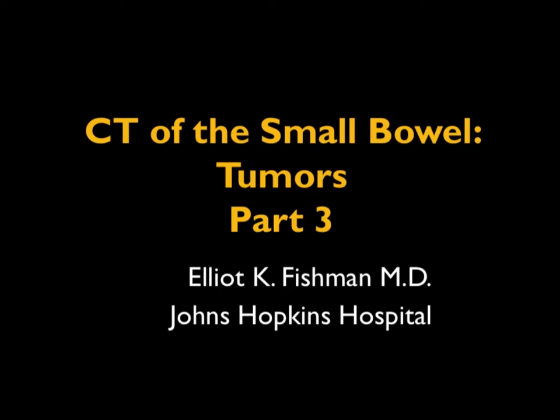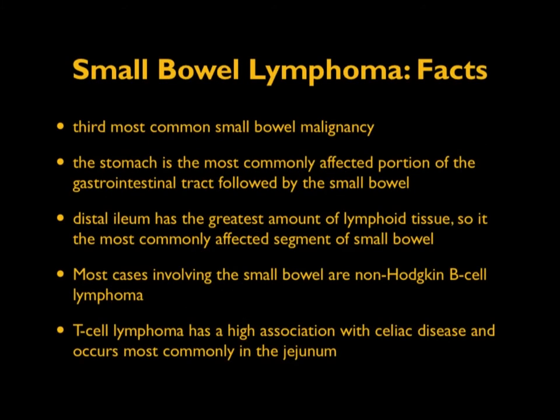So this will be part 3, and this will be the last part of small bowel tumors. As I mentioned, we did GIST, carcinoid, adenocarcinoma. Let's pick up with lymphoma, third most common small bowel malignancy.